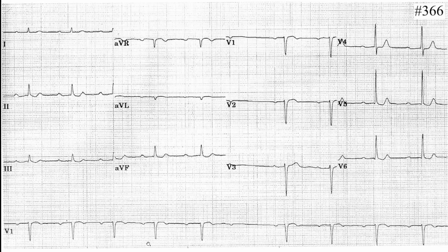Everywhere. No, not in the AVL. In V1, if you do see, because that's a longer strip, these are the P waves, and the P's come regularly. However, not every P is followed by QRS. We have a dropped P. So what does it mean? Premature atrial beat? No. It cannot be an impulse formation abnormality because the sinus is firing regularly. And 1 P not followed by QRS, so it has to be a conduction abnormality.